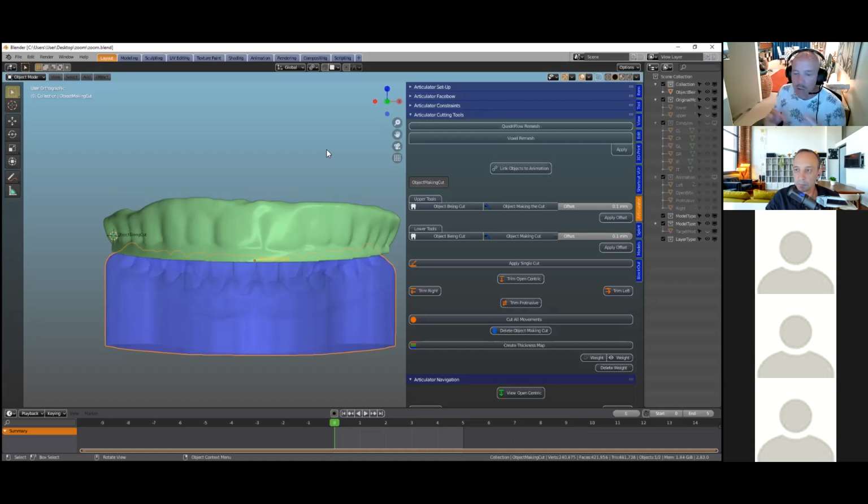Somewhere there was an overlapping vertice. And then all you need to do is go back and set the offset to 0.11 or 0.09. Just adjust that a little bit, and then you'll find that the Boolean cutting will work. So that's just a safety thing to fall back on as well.